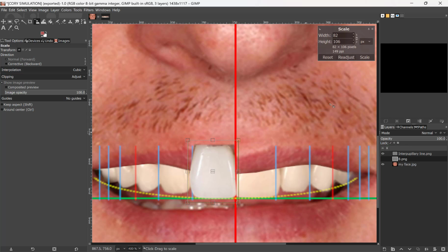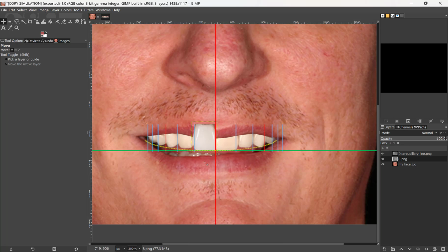Now, you're probably thinking, well, that's a lot of trouble to create individual tooth libraries, and it is. But one of the cool things is you don't have to create an individual tooth library of the entire arch of teeth, right? Think first molar to first molar. I do one side because what do we want in a beautiful smile? We want symmetry. So I just did one side.